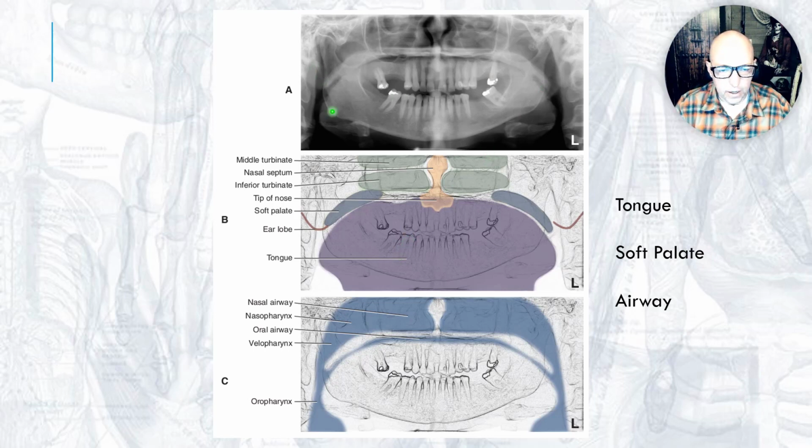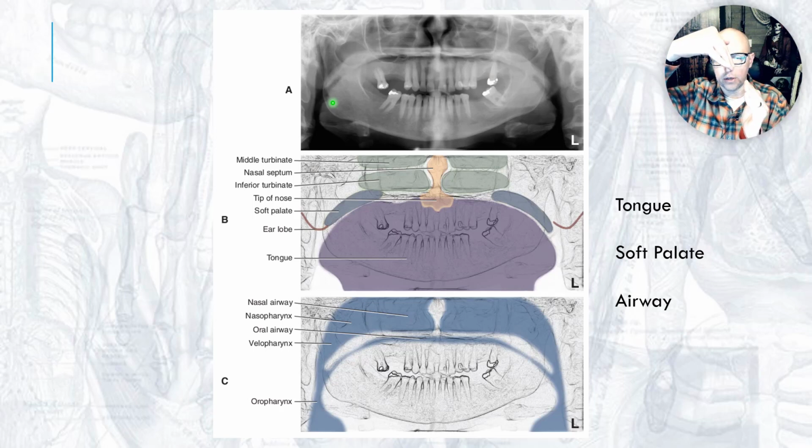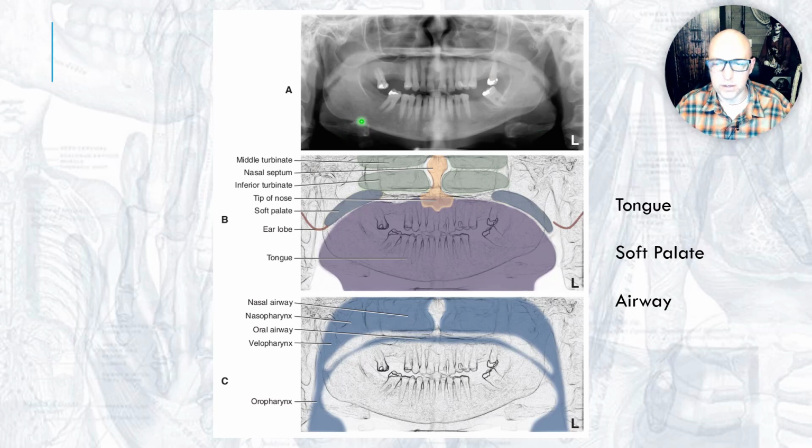And this doesn't point it out in their image down here, but you can see, what is this? You think of it kind of like the inverse of the uvula. The uvula hangs down, you have this cartilaginous tissue that goes up. This is what helps you swallow and breathe, and hopefully not both at the same time. That's your epiglottis. They've got some somewhat pronounced lingual tonsils here, the base of the tongue. That's where your lingual tonsils are. Sometimes that stands out as really pronounced. Other times it lays flat against the tongue, so you can't really distinctly see the epiglottis.